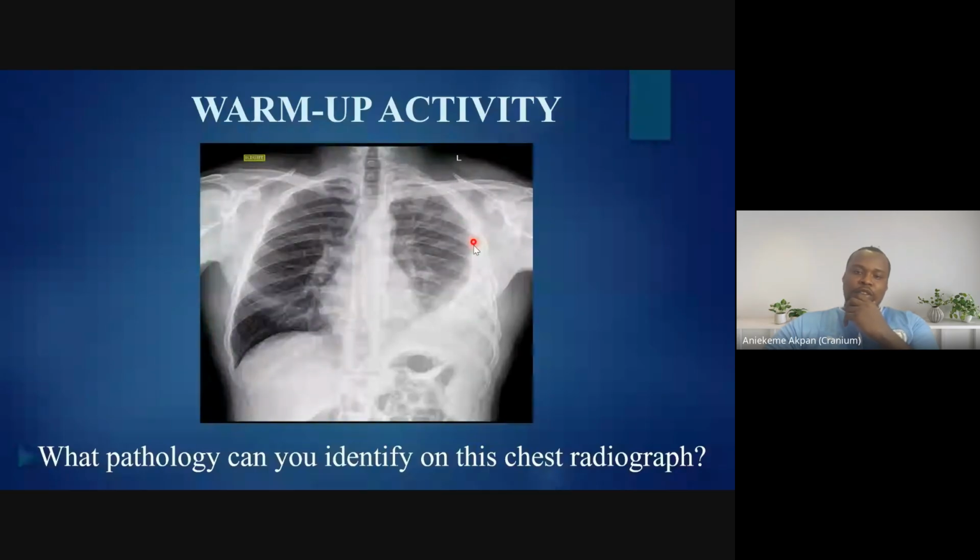But we are going to get to that in detail. So this is obviously not a case of pneumothorax because, of course, this area is not dark, there is no air there. So it points more towards pleural effusion.